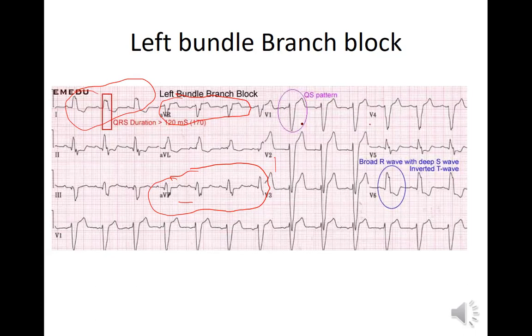So let's go look for rotation. Negative, that's good. Really negative, the amplitude of these things. V3 negative, V4 negative. The transition is between V4 and V5, which is positive. So this is leftward rotation, because we're in the chest leads. Outstanding. Now let's take a closer look.